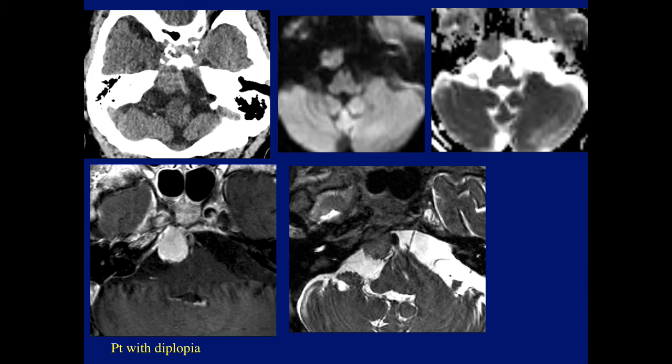And here's a patient with diplopia, one of our cases, diagnoses. And Asif mentioned correctly meningioma, but again, it would be hard to say, is it a schwannoma or meningioma? In this case, we see the marked enhancement. And again, notice the normal sixth nerve on the left side, and where we'd expect the right side, there's this big lesion. We cannot even identify the nerve. And this was a clival meningioma.